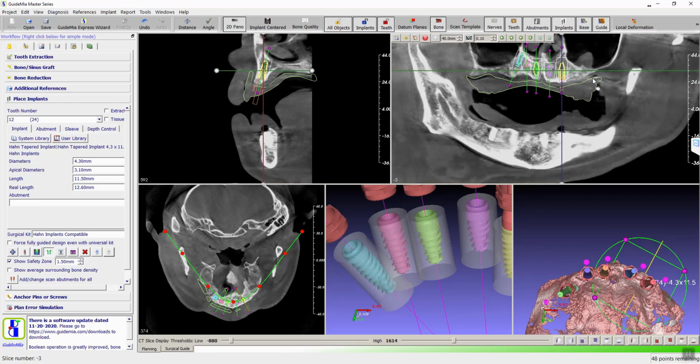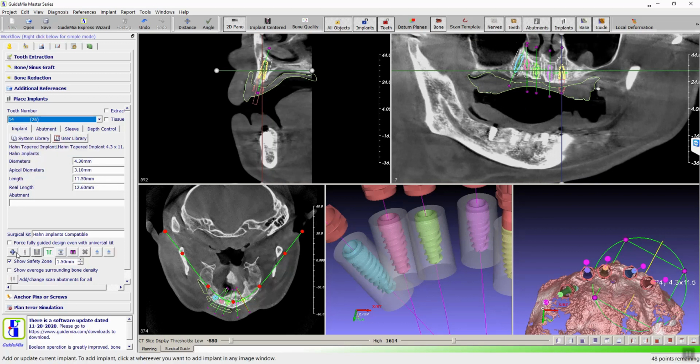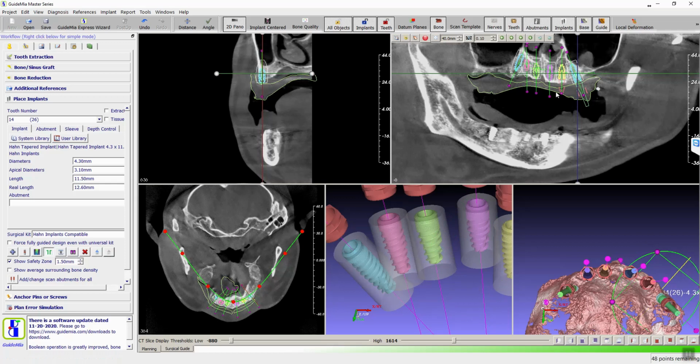What do you think? That's fine. And then number 14. Do we need 13 for this one too? 13. Yeah, because we're gonna angle it. Well, you probably don't have space. Don't have space, even if you angle it.